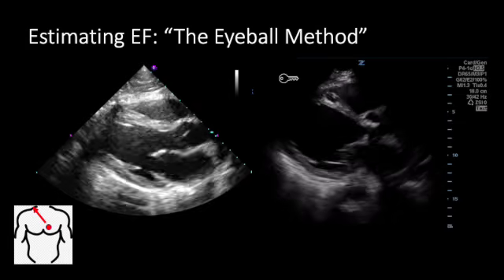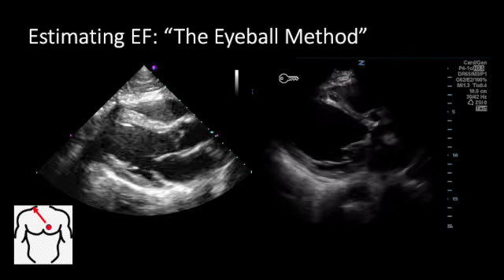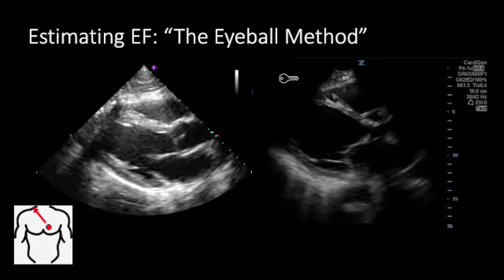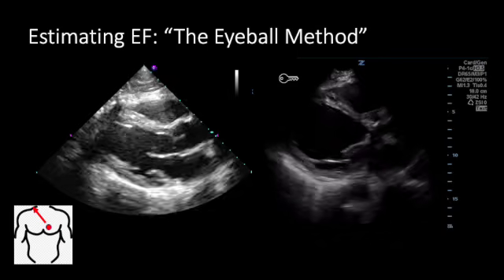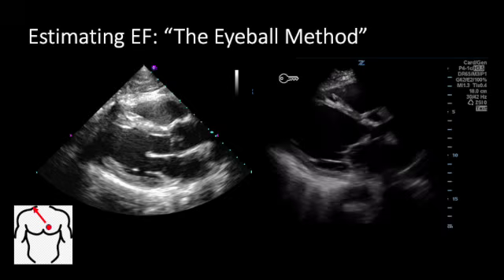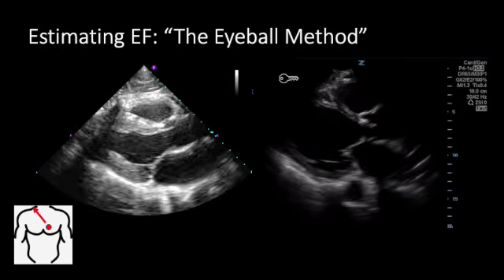So here I've got two pictures of two separate hearts that are dynamic clips occurring during systole. They're at different gains, so the left one is more gained, the right one is probably a bit undergained. But in both of these, we can see that we're looking at relatively the same spot in the heart in a parasternal long axis view, if you can remember your standard windows from the last lesson. Now I'm just going to tell you, for completeness' sake, that the left picture, or left clip, is a heart with a normal ejection fraction. And the one on the right is a heart that has a severely reduced ejection fraction.